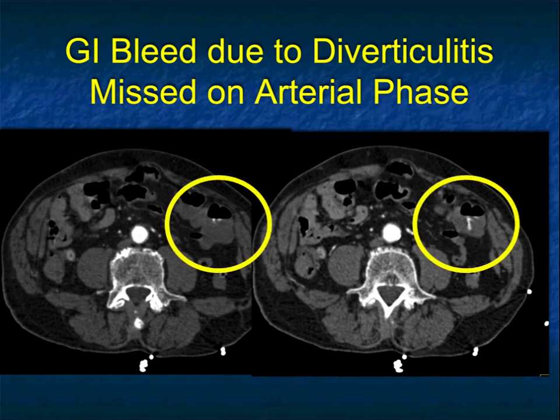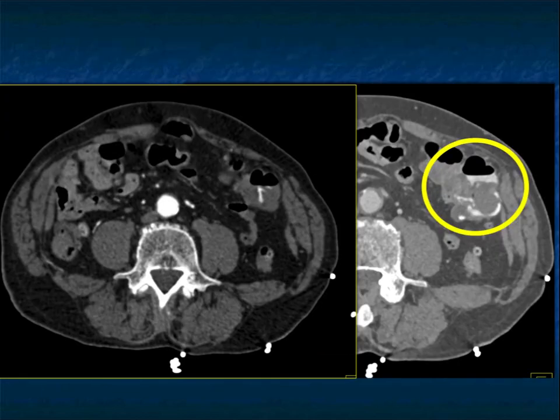Now, let's say you weren't sure. Theoretically, if you had a non-contrast scan, you could see high density there or not. But the thing I found with non-contrast, often it's not that helpful. And if you want to do two phases, it's better arterial and venous. Between arterial and venous, you see every bleed. Many of the venous phase studies best show the bleed. And when someone's bleeding between arterial and venous, the likelihood of a positive angio is indeed much higher.